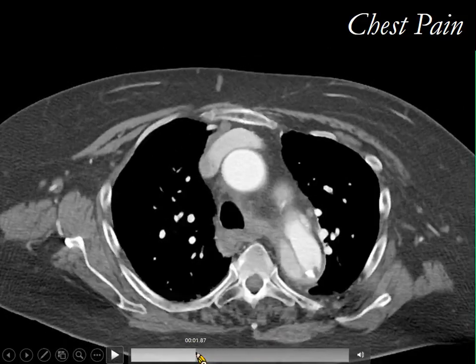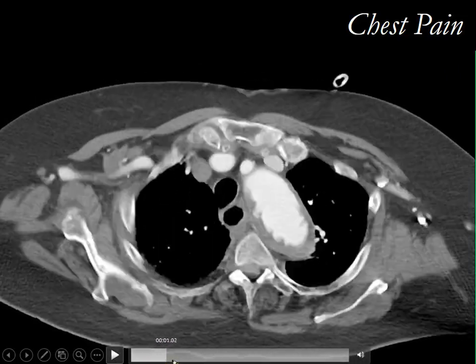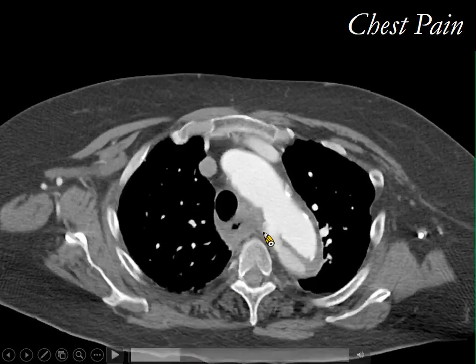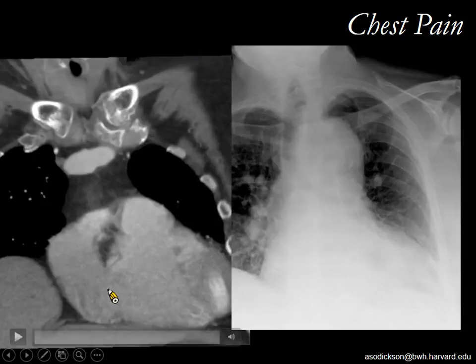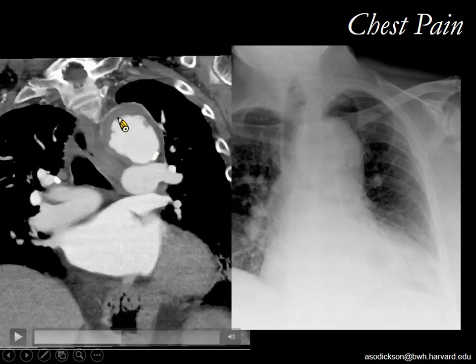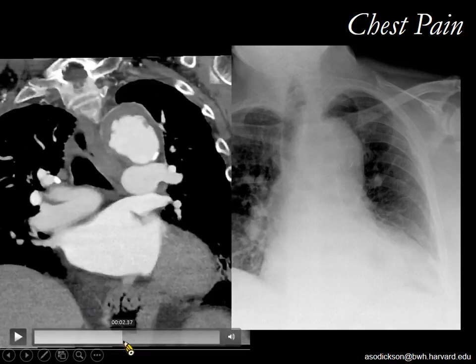And so this patient has an aortic dissection of the aortic arch and the descending aorta, likely related to this advanced ulcerated atherosclerotic disease. If we look at the coronal images, you can see that this upper border here matches this contour that we're seeing here. This is the border forming part on a frontal X-ray here, and part of this contour abnormality has been distortion from this false lumen that is pushing the aorta upwards.